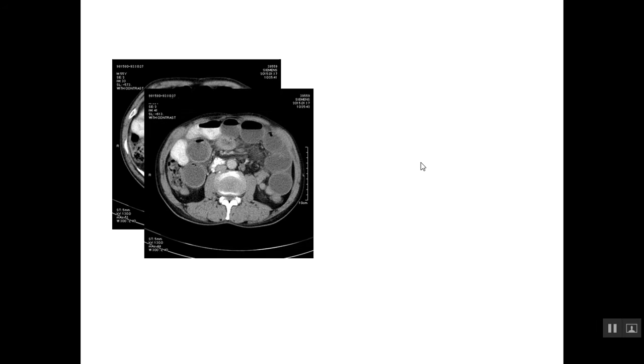As you know, kidneys appear normal, aorta and periaortic region appear normal, and some bowel loops are fluid filled and maybe dilated. The next slide demonstrates more dilation of small bowel loops, predominantly filled with fluid and somewhat with gas.